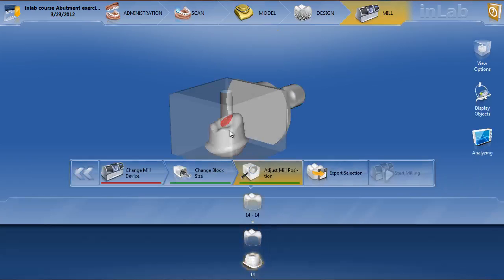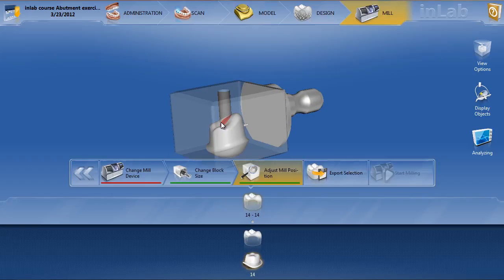So hopefully these two videos gave you a nice overview on how the abutment process works. Clearly not every case goes like this, so we'll have many more troubleshooting videos on how to get past normal everyday situations, how to splint abutment crowns, how to parallel abutments, and all sorts of different things we'll get to down the road.